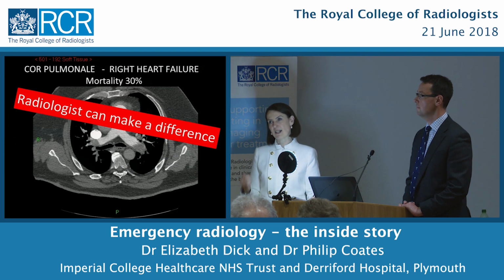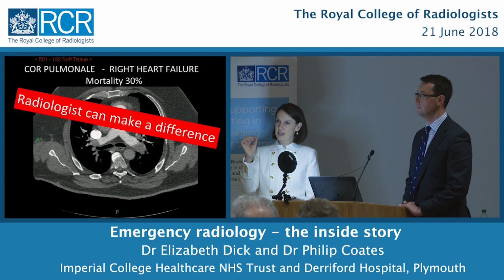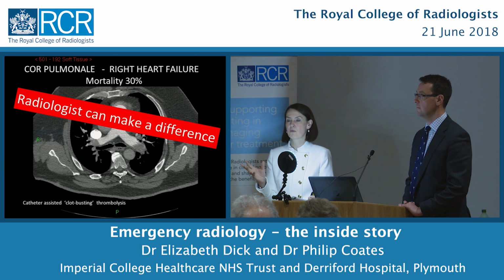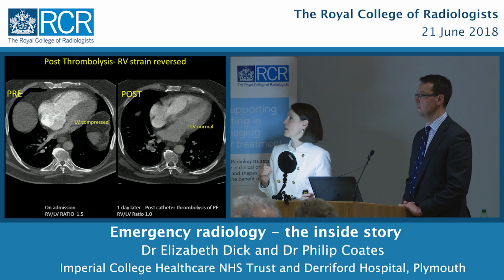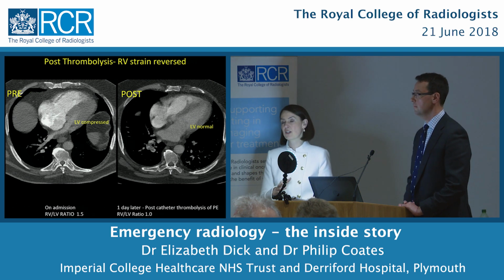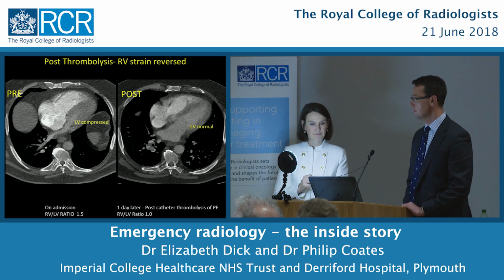What they did was they threaded a tiny catheter in through a vein in the groin and into the pulmonary artery, and they put the tip of the catheter in that clot, and they dissolved the clot with clot-busting medicine, or thrombolysis. And just a day later, after that treatment, the patient is so much better. You can see exactly how much greater the left ventricle is now compared to the right ventricle. So radiologists can make a real difference, not just in diagnosis, but also in treatment.